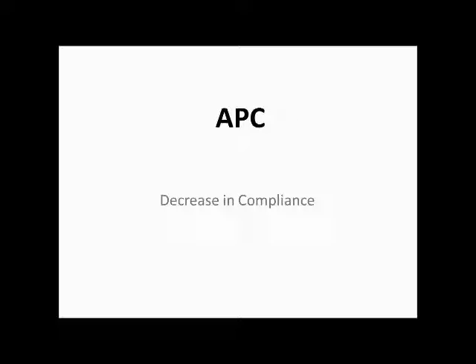Now, the first video is adaptive pressure control and what happens when there are decreases in patient's compliance. You're going to have the same changes if there are increases in patient resistance or airway resistance, but for the lung model I'm using, a decrease in compliance.